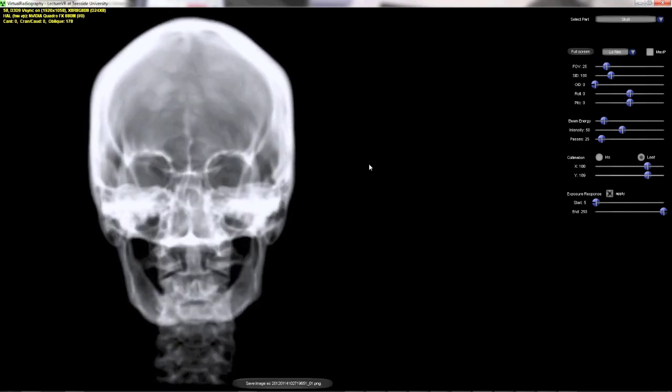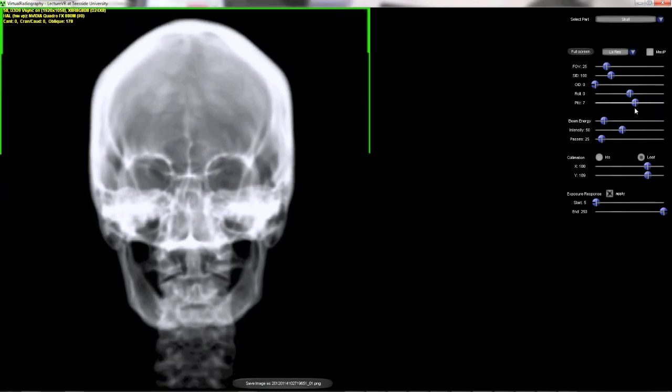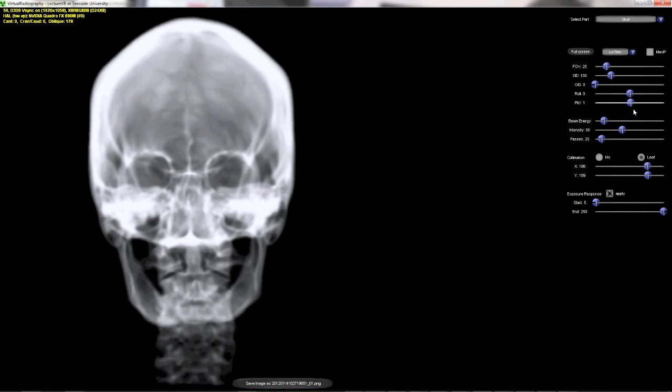We created a simple interface that allows the effects of rotation, centering, angulation against the receptor and magnification to be shown in real time to a class of students in a lecture theatre. We call it Lecture VR.